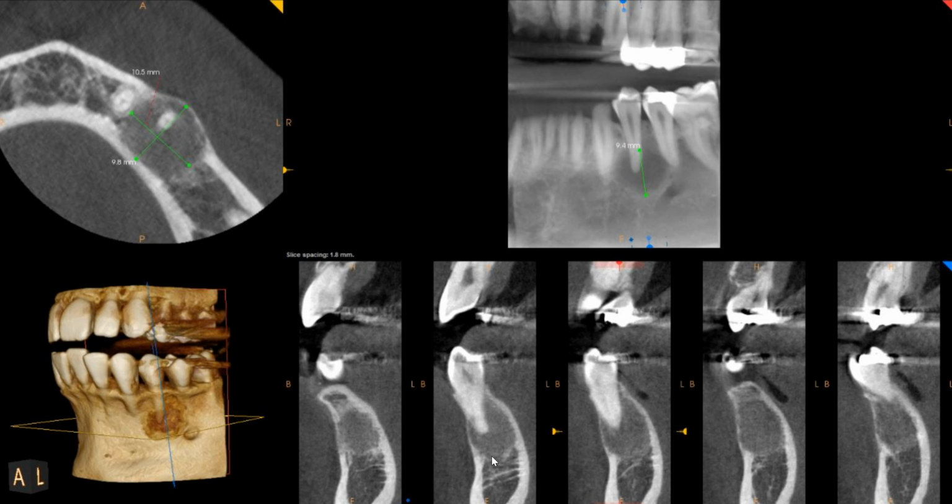So now my pathologist came and showed me this because she's a little confused as well, because under the microscope all she sees is just normal bone. So now that changes our radiographic diagnosis substantially, right? So what I'm thinking at this point is probably a healing simple bone cyst.